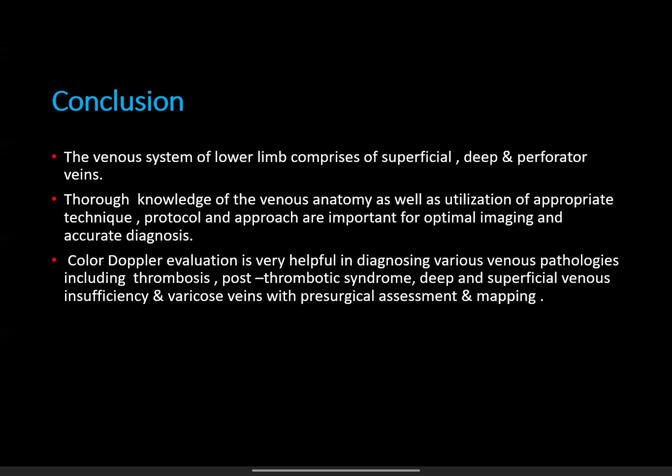Color Doppler evaluation is very helpful in diagnosing various venous pathologies, as we have seen in a couple of examples, including the most common pathologies like thrombosis, post-thrombotic syndromes, deep and superficial venous insufficiency, and varicose veins with pre-surgical assessment and mapping.